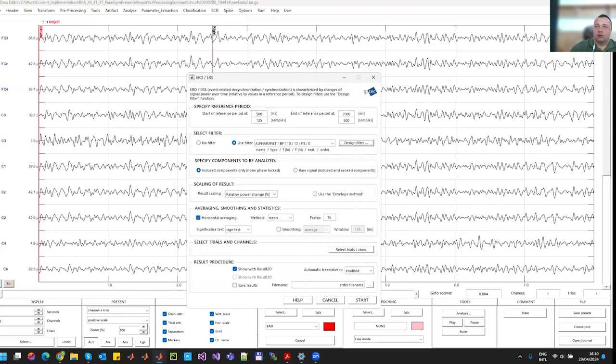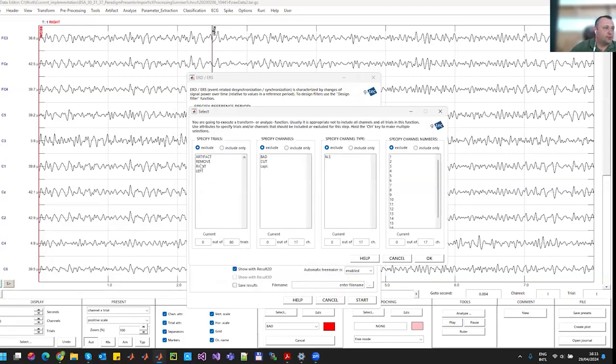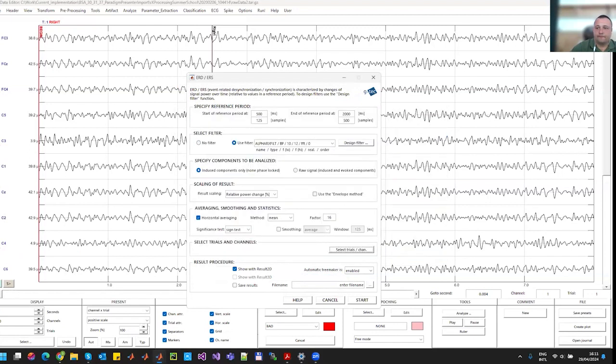And now I will include only the right trials. Include only right trials and channel number 5. Okay, and start.